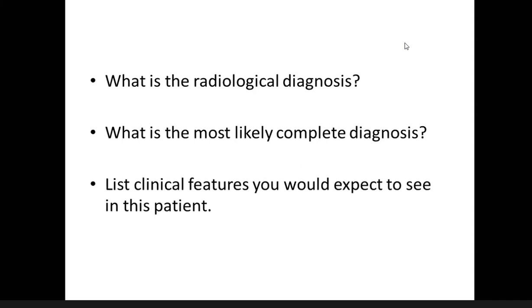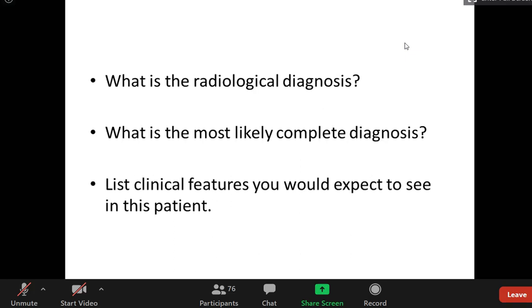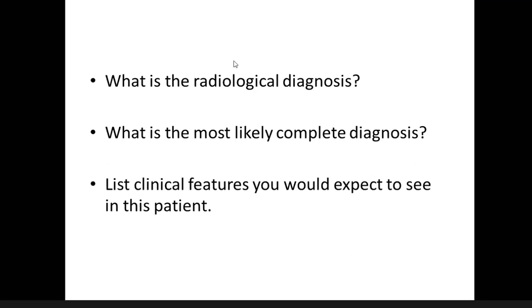So in a patient with a moderately large right-sided pleural effusion, still the trachea is in the normal position. How are you going to explain that? Pleural effusion is complicated with what? Right, lung collapse, or lobar collapse. So if it is associated with a collapse, then even though the patient is having a large pleural effusion, the trachea may be in the normal position. Right? Okay. So then what are you going to do?